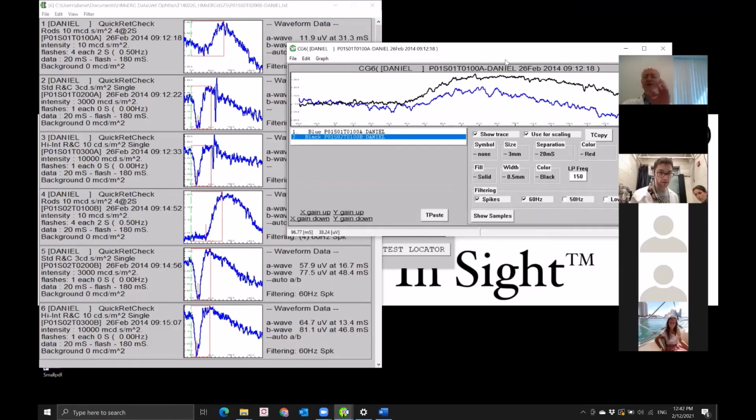Full field flash, that is something we can talk to Ron about, what you can really get out of the RGCs, as well as the other types of methods of ERG, multifocal, what you can get from those different cellular constructs. So let's definitely put that into a question for Saturday. But thank you, that's a good question. We're just going to review here.